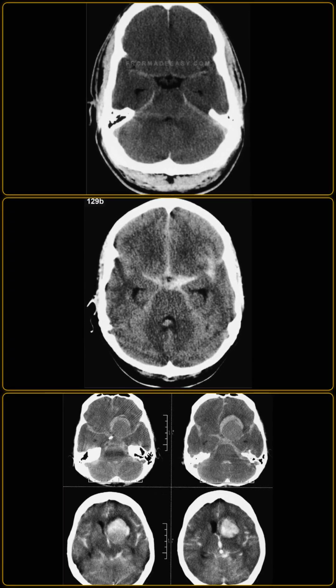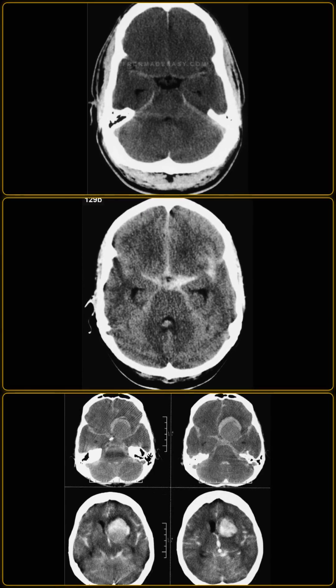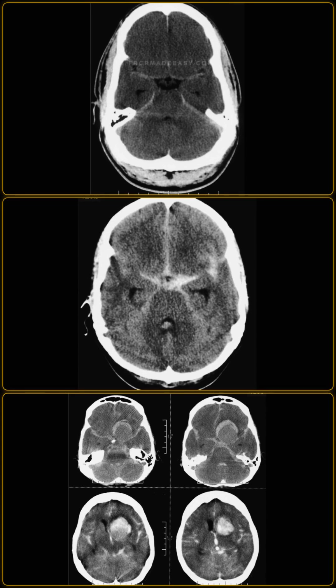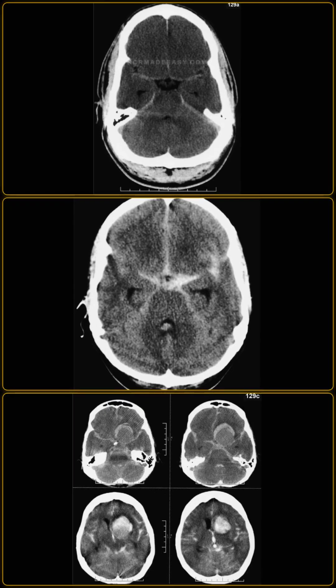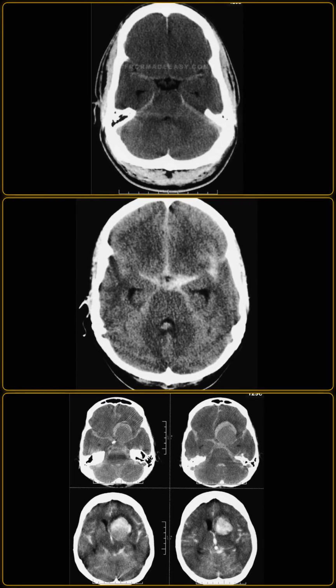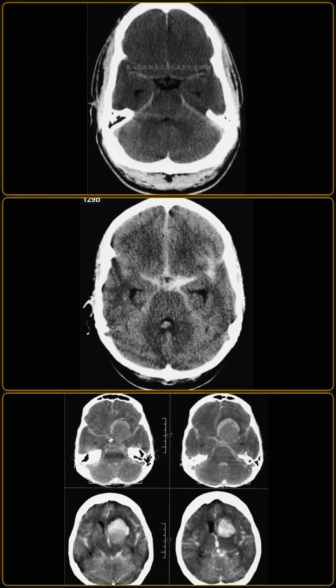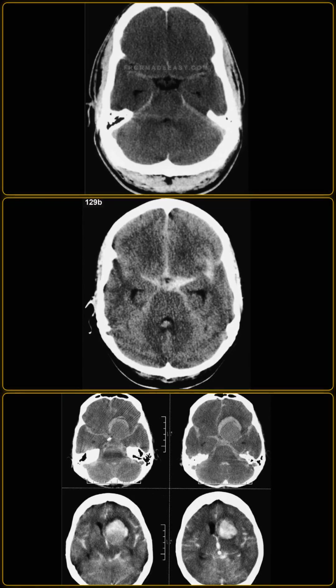Discuss the clinical implications of the pseudo-subarachnoid hemorrhage sign on CT and its diagnostic pitfalls. The pseudo-subarachnoid hemorrhage sign is a well-known pitfall where diffuse cerebral edema makes the tentorium and cerebral blood vessels appear hyperdense relative to the swollen hypodense brain parenchyma. On first inspection, this can easily lead to an erroneous diagnosis of acute subarachnoid hemorrhage.